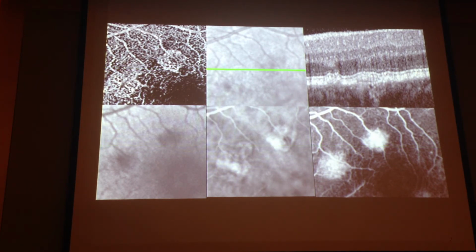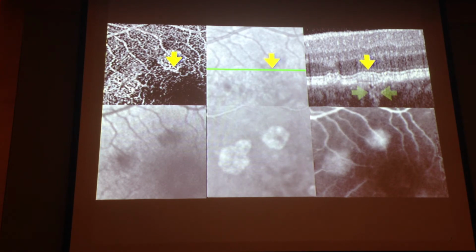And you see one thing quite interesting: of course these are not choroidal neovascularization, but just lack of RPE cells. And the lack of RPE cells is seen in the autofluorescence. Now, why do we see white, and it looks like a net, a choroidal net? Because if you look here in the OCT, you see that there is some transmission of the light.